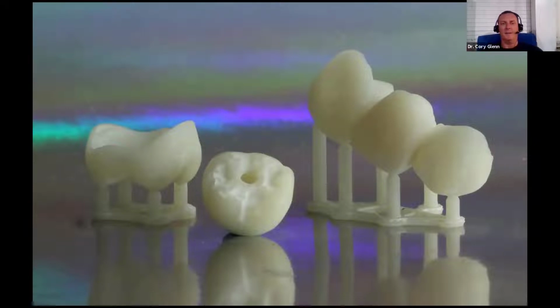One of the things to point out on this is, especially if you look at that tie base crown on the occlusal surface, it's got that really chalky look. Part of the instructions of this material is that after you print it, you're going to alcohol wash it, and then it actually has to be sandblasted, because this is such a highly filled resin that when it washes away that little bit of oxygen inhibited layer of resin, it leaves exposed portions of the filler particle. And so you do have to sandblast that to get rid of it. Of course, that's only going to help your bond strength as well. And then you would just cure this, and then it's ready to go in the mouth.